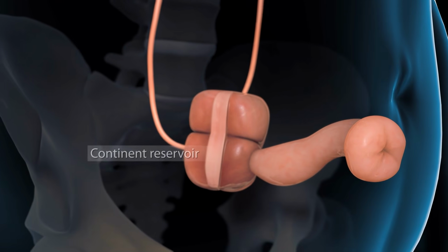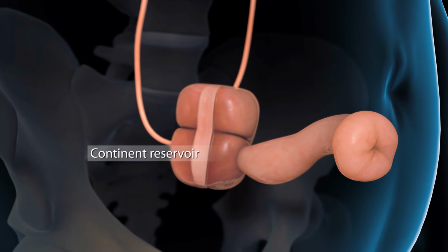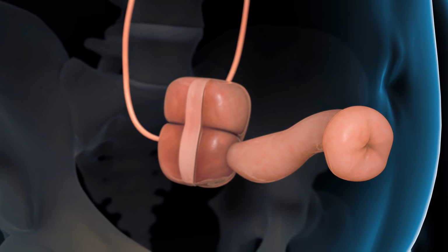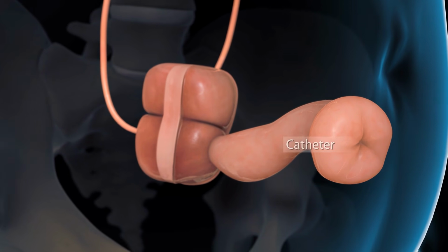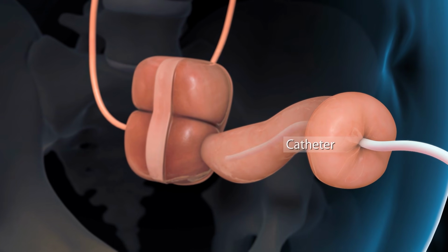If you receive a continent reservoir, your surgeon will make an expanded pouch from a section of your intestine. Your urine will drain through a catheter in the stoma.